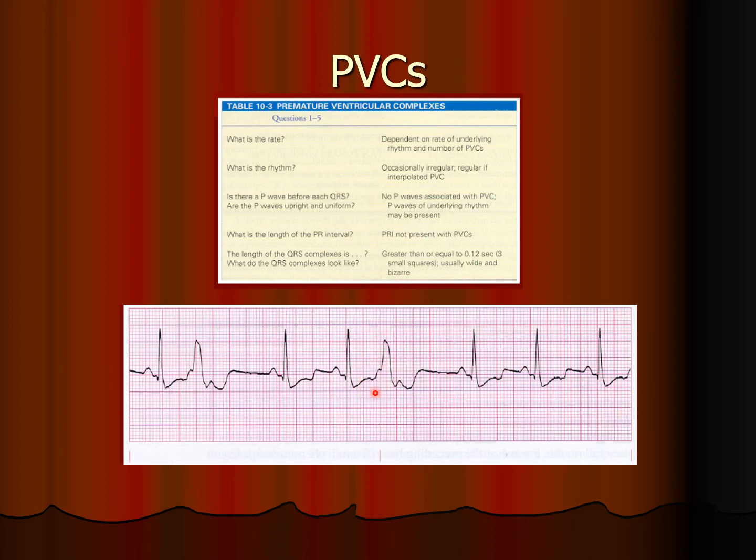We've got a couple of beats in a row that look pretty darn good. So we have a pretty regular rhythm over here. We have a P wave. Okay, that's all right. We have some skinny QRSs. Okay. Oh, we got something going on.